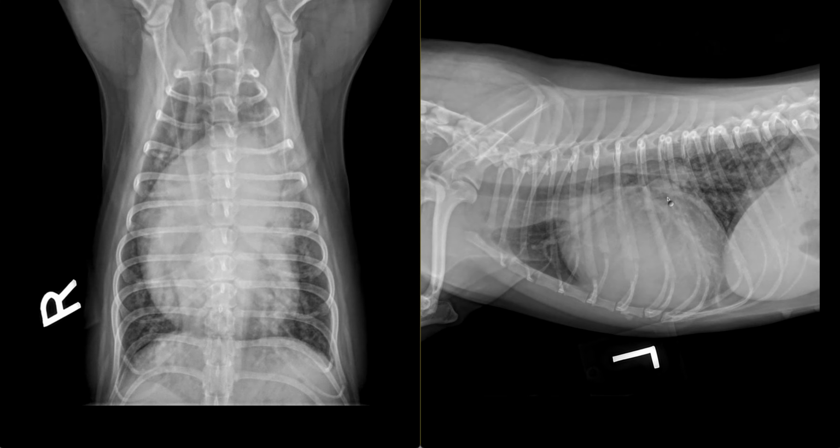The pulmonary parenchyma generally has an increased opacity as well. The caudal contour of the heart has a normal shape without straightening of the caudal cardiac waist. Although dorsally displaced as previously described, the trachea does have a normal diameter, unlike the left caudal mainstem bronchus, which does appear narrowed. The lobar bronchi taper and have an appropriate diameter. The mediastinum and pleural space are unremarkable.